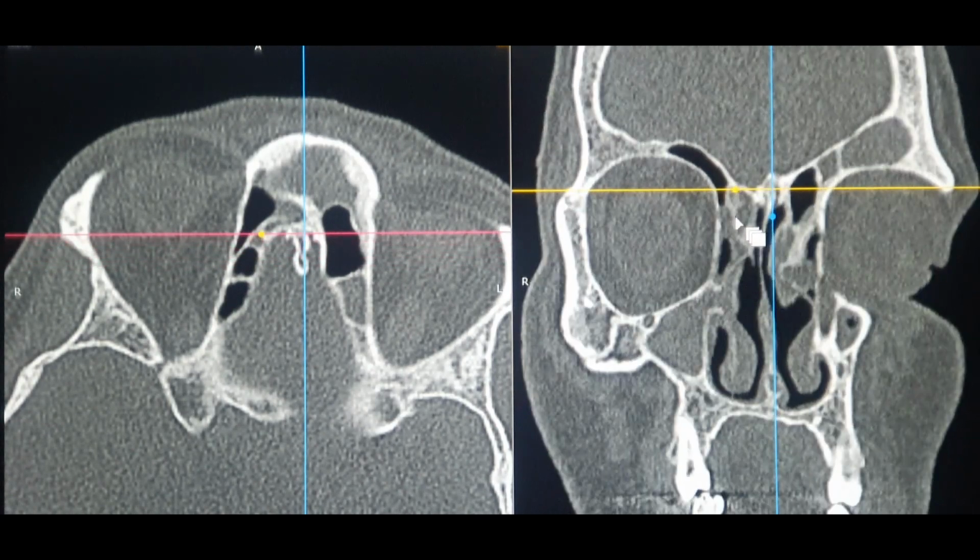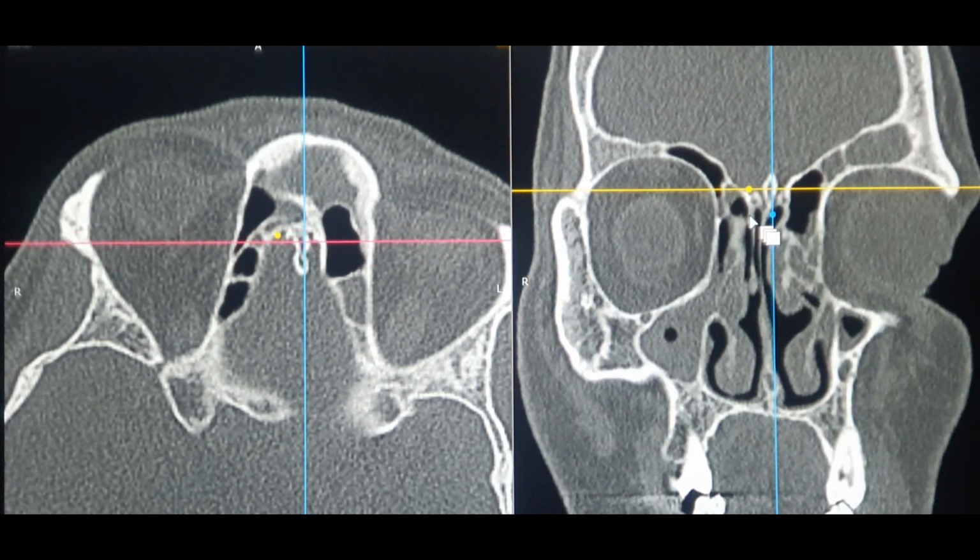And then you can start seeing the most posterior aspect of the frontal sinus, almost towards its posterior wall. Now this being the supraorbital cell, this is already a very posterior area, as you can compare on the axial scan. Behind the frontal sinus, the crista galli will appear like it is appearing right now. So this is the concept you always need to remember. The moment the crista galli starts in surgery, that's the area of the cribriform as well.